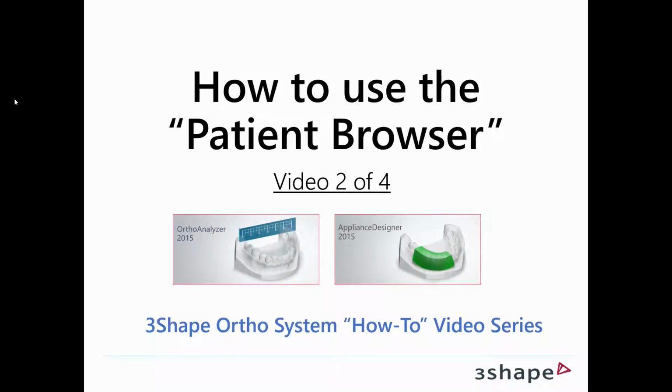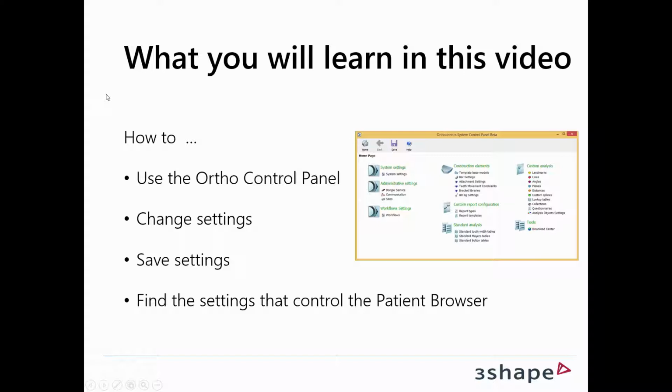Welcome to the second of 4 videos teaching you how to use the patient browser in the 3Shape Ortho system. What you'll learn in this video is how to use the Ortho control panel, how to change settings, how to save those settings, and how to find the specific settings that control the patient browser.